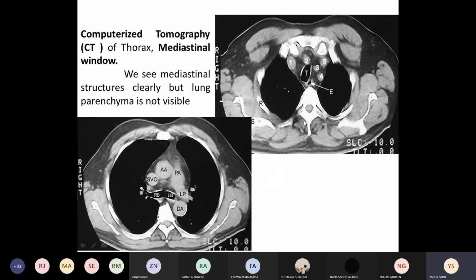And this section is below this. ليش؟ لأنه the trachea is starting to bifurcate into left and right main bronchus. لاحظ إنه التراكية هي إيش؟ tubular structure containing air. هنا after bifurcation or dividing into right and left main bronchus, this is left lung and this is the right lung.